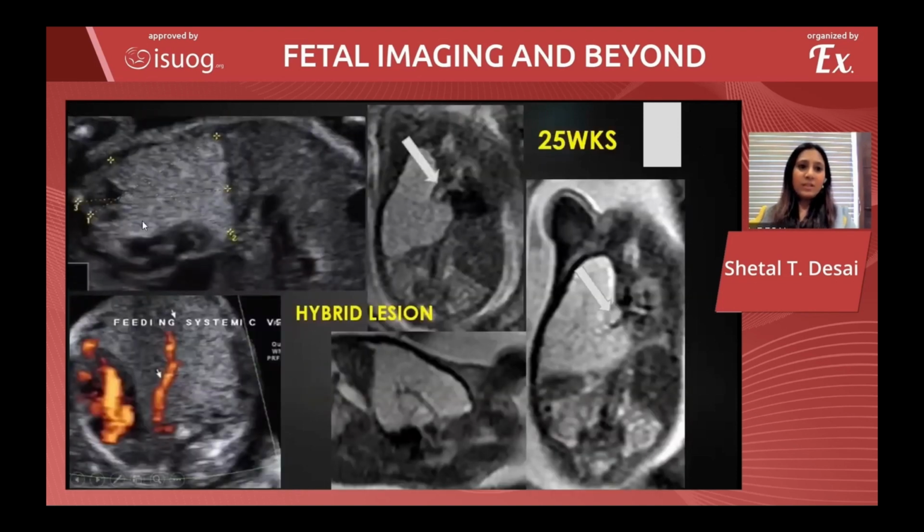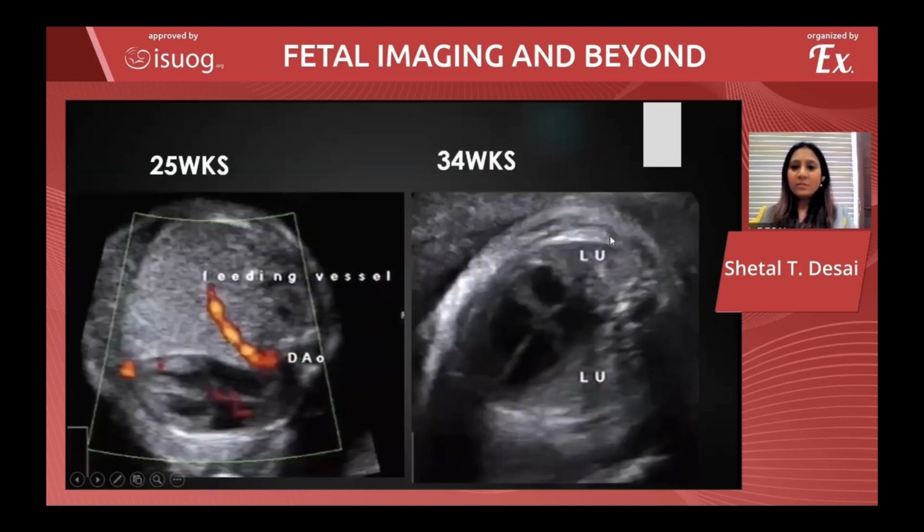This was an echogenic lung with a flattened diaphragm and a feeder vessel. So a diagnosis of a congenital lobar overinflation with associated bronchopulmonary sequestration was suspected on ultrasound. MRI, however, showed that there was a proximal bronchocele suggestive of a bronchial atresia. And because of the mediastinal shift, these lesions need to be monitored for fetal hydrops. On follow-up, this lesion was shown to regress.